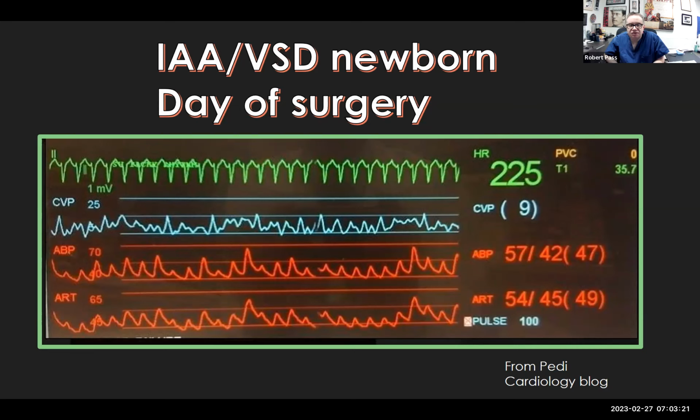You know, as we've discussed many times, you don't want to make any diagnoses in people for arrhythmias based on a single lead of the ECG. And the reason that I've included this tracing today is because you really can't tell from the EKG what the rhythm is. We can see that it is fast. We can certainly accept that the heart rate is 225, but you can't really tell from this monitor tracing whether or not there are P waves before every QRS or after, or if there's ventriculoatrial dissociation. So from the tracing alone, you can't tell.